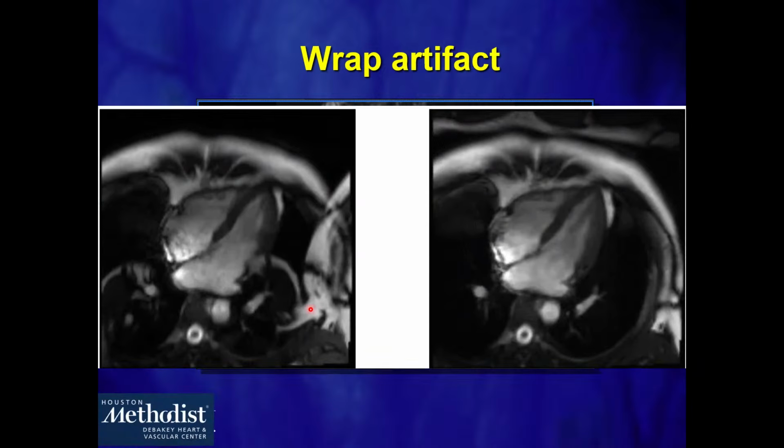So typically what you need to do in these cases is increase that field of view. Take a look at the opposite tissue over here, or the hand in this case, or the arm, which is wrapped across this field of view, and you have wrapping here and an artifact here. And then once you increase that field of view, you're going to decrease that artifact in this scenario.